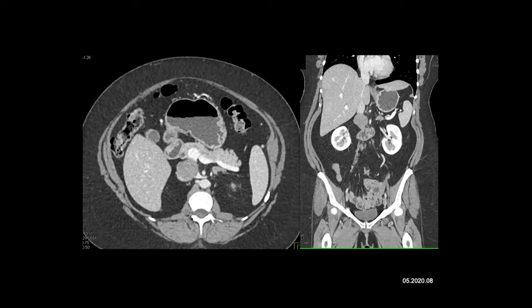Neuroendocrine tumor, it's not vascular, so unlikely. And this really is away from the duodenum. It's not a duplication cyst. So what could it be? I did consider all sorts of malignancies. Lymphoma is a good thought.